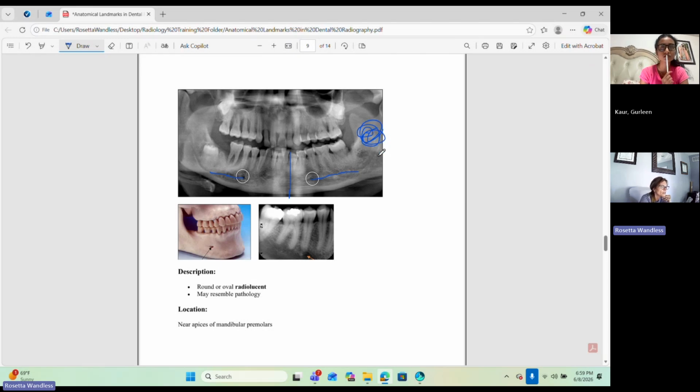I'm going to show you something here. Do you see this area here? This empty space here, this cavity? It's empty, right? That's where nerves are, nerves and blood supply again. So if the doctor's doing an injection here, it's going to give the medicine here. This travels all the way up and innervates all up to here. That's why you get that nerve block and it stops right at your chin. Does that make sense?